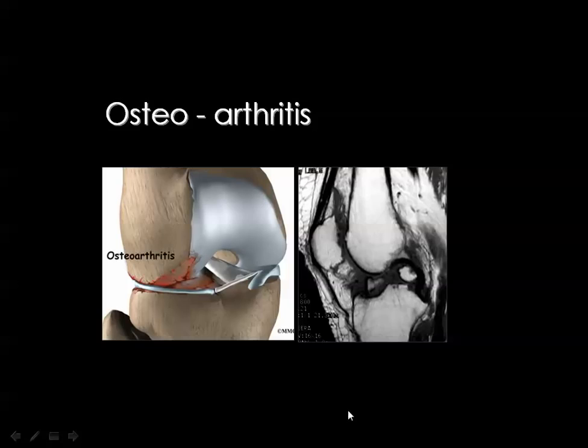In osteoarthritis, you get the usual manifestations in the knee, and as in every large joint in the body, these manifestations will include certain pathologic entities. One of them is the development of loose bodies. And you should know that if the loose body is large, it will develop a marrow cavity, and it will show the same signal intensity similar to the femur and the tibia.